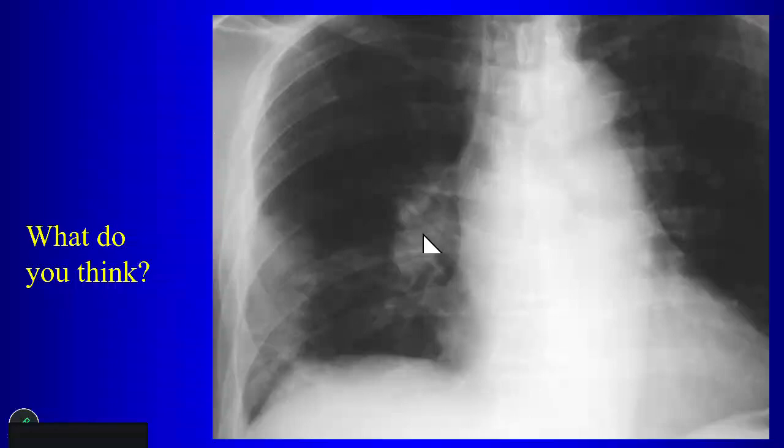So that's called Fleischner sign. A PE is usually on CT, when we have an infarct, we see a wedge-shaped peripheral opacity, right? That's the classic description. Why is this Hampton's hump and not Hampton's corner? It's not a corner, it's a hump. It's rounded off. Why is that?